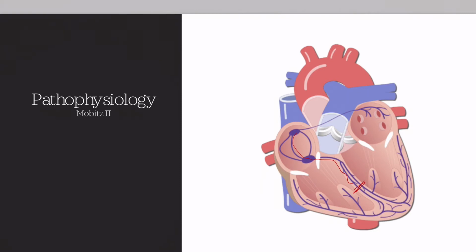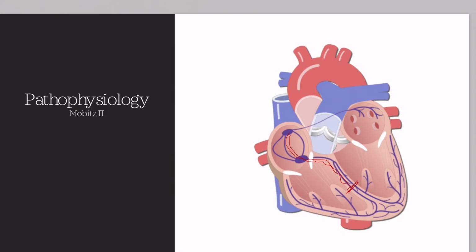So we're going to have a regular PR interval, but we're going to have dropped beats occurring regularly throughout the rhythm. So the PR interval is fixed, but as we're sending our signals down, atria contract at regular intervals. We're not going to be having our ventricles contract. So this is just a much higher risk for hemodynamic instability or sudden asystole.